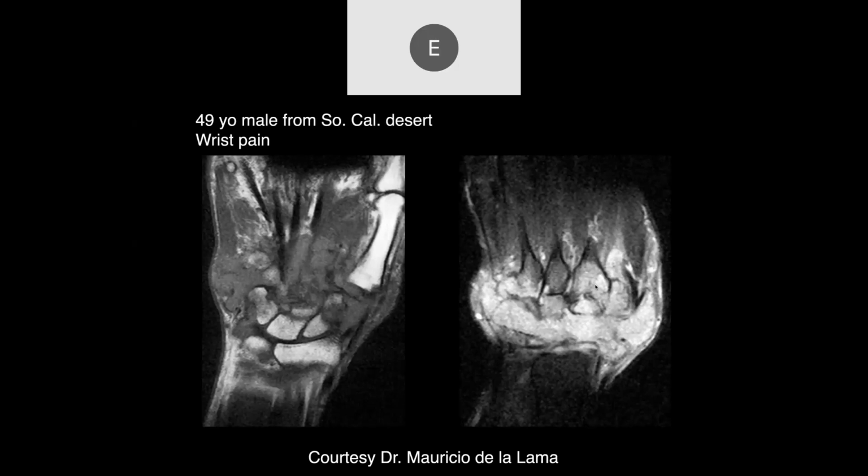Is this another case of cocci? It could be, but this is multiple joints. It's a little bit atypical for rheumatoid because rheumatoid usually starts out involving the radial and ulnar carpal joints. These are really more distal, and they're sparing the radiocarpal joint, which would be a little bit uncommon for psoriatic as well as rheumatoid arthritis. So you have to think about something that's atypical. Multiple bones and multiple joints are involved here, so again, you've got to think about some sort of atypical infection.